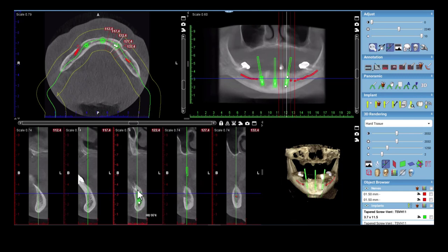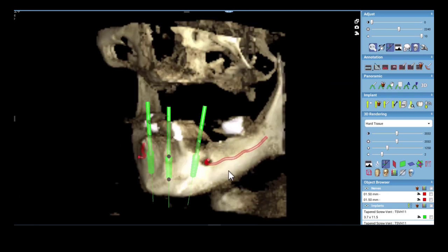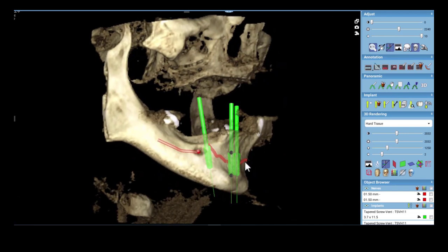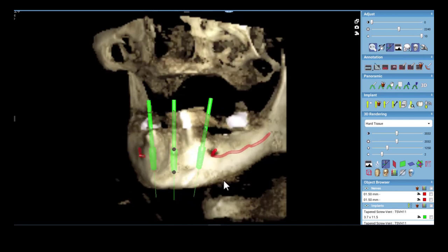Okay, so plenty of bone down below the implant. You can see on this one, basically the bone reduction will be right to the apex of the root of the lower left. Looks like that might be a premolar back there. Okay, so we'll maximize here. We'll take a look. Okay, I like that pretty well. We'll mark the mesial of that foramen during the surgery.